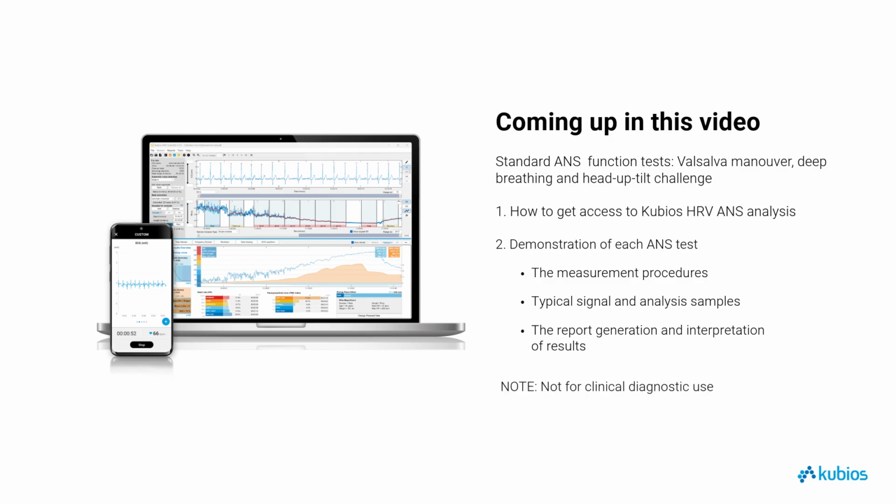It's important to note that the results of autonomic nervous system function generated by Kubios HRV are intended for informational purposes within a professional health and wellness context, and are not for clinical diagnostic use.